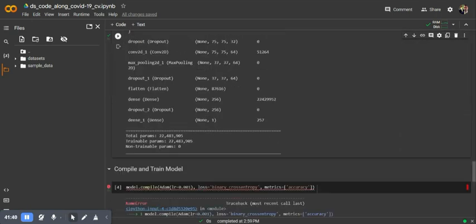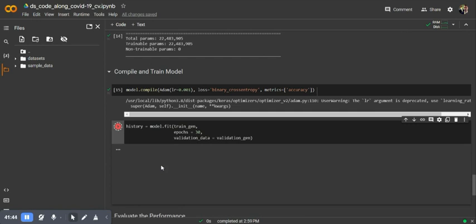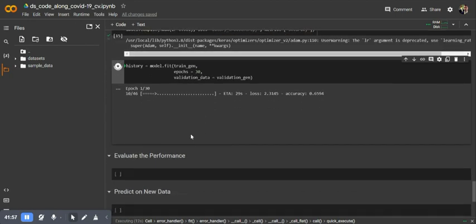Schoolboy error. Compile. And let's start the training again. I've changed it to 30 epochs because as it was running, I noticed 50 was going to take a long time, as each epoch was taking between 30 seconds and a minute. So that's no good. We've started that again. Let's wait until the training finishes and we'll get back to it.